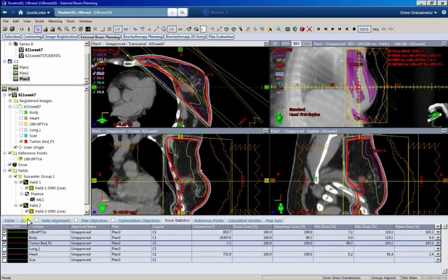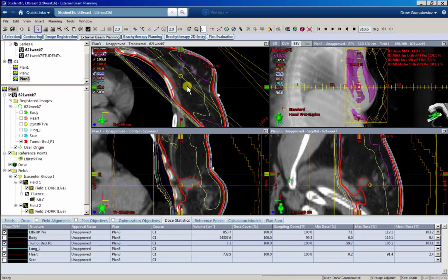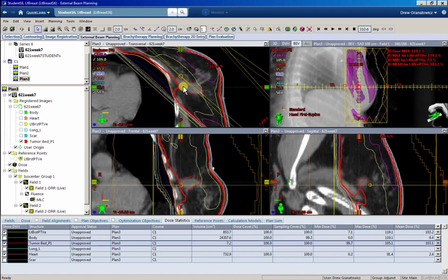Still a tiny bit cold somewhere, but this might be an okay place to start. I think I'll start here. So I'm a little bit cold, but for these plans, it's okay to start like that, which will make more sense when I get to that point. But we should be able to handle that a little bit later.